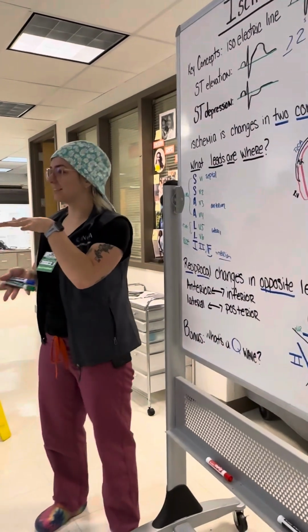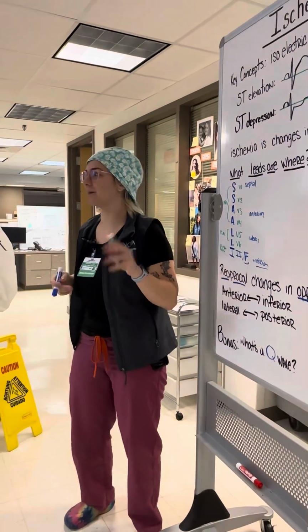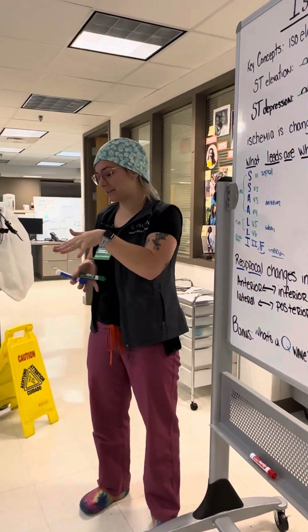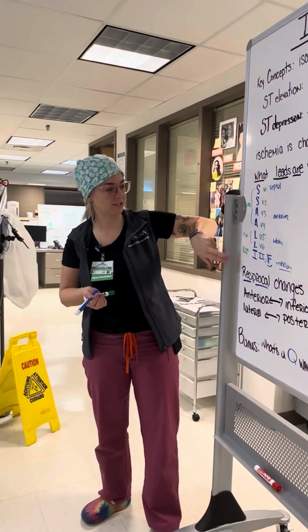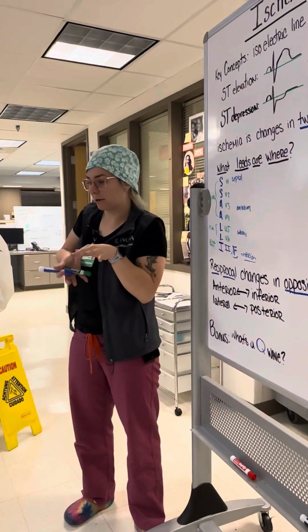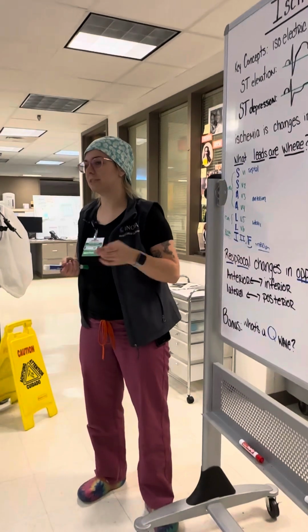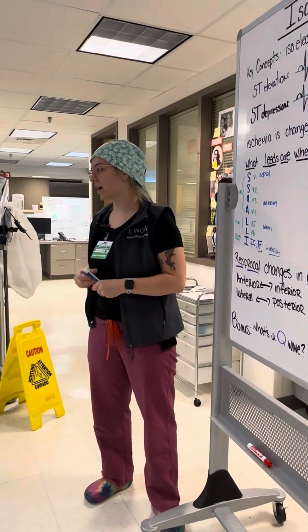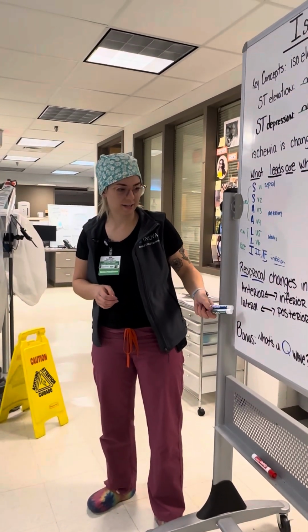Remember nursing pre-regs? You had that packet, and it asks, what's the opposite of medial? Lateral. So it's the same thing. The opposite of anterior is the inferior part. So your anterior leads are going to reciprocate for your inferior leads, and your lateral leads are going to reciprocate from your posterior leads, just the way that the heart sits. We can get posteriors if we do a back EKG, or sometimes it'll extend into your AVL. So that's how you look at the anterior and inferior leads.